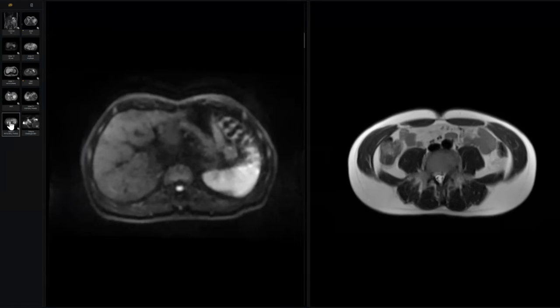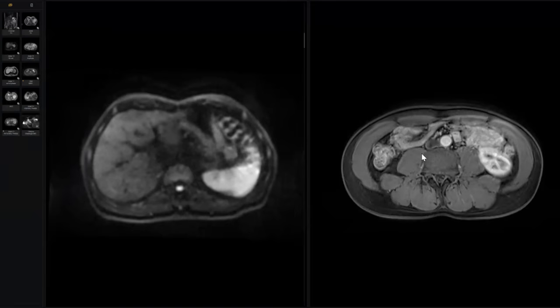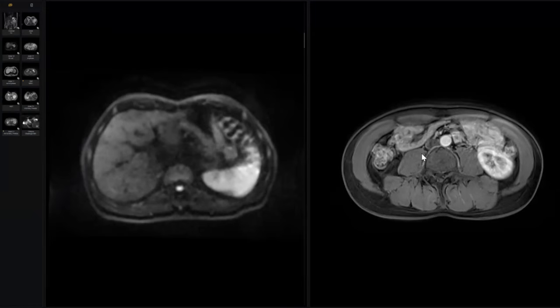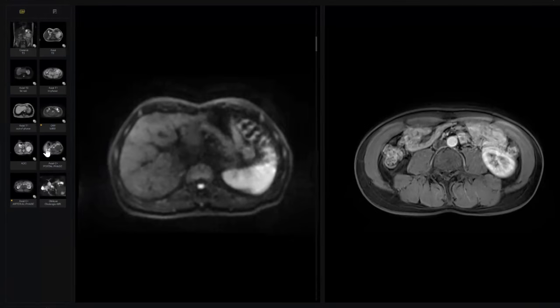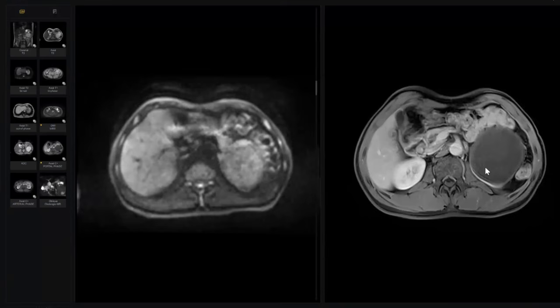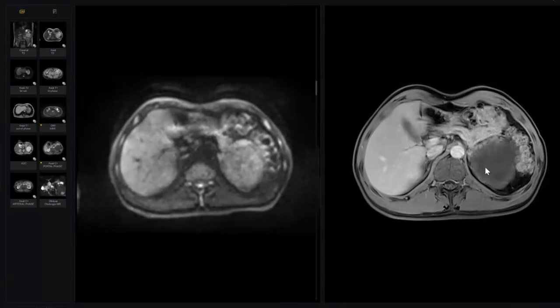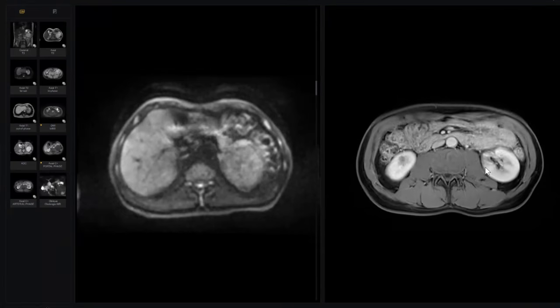Okay, what happened here? This is the MRI post contrast. This is the arterial, I think. This is the portal. At least in the portal, you can detect. Look here, the larger cyst shows completely no soft tissue component, no enhanced soft tissue component.